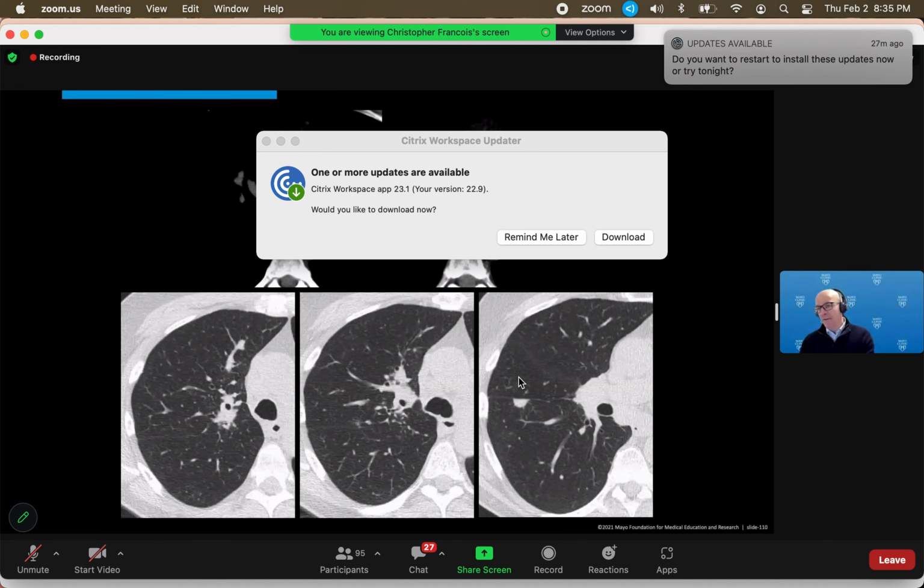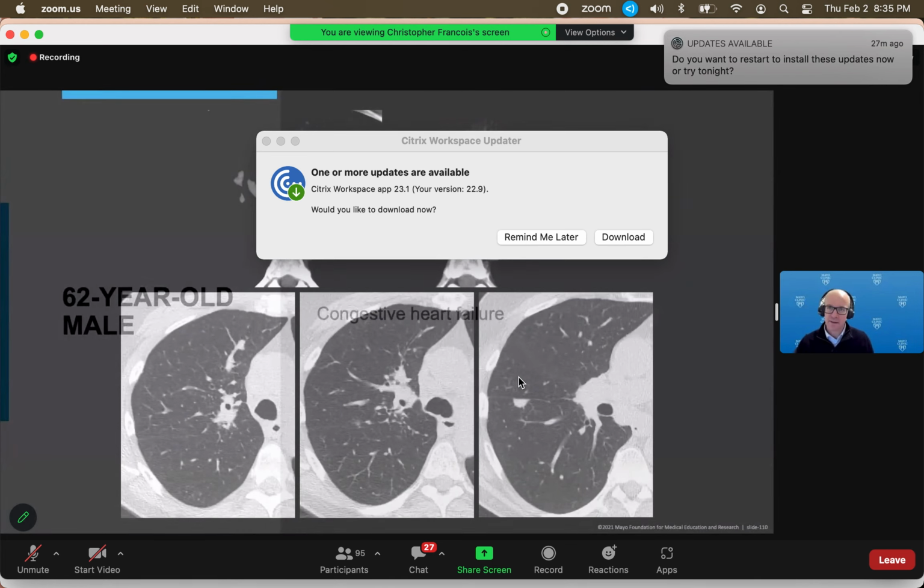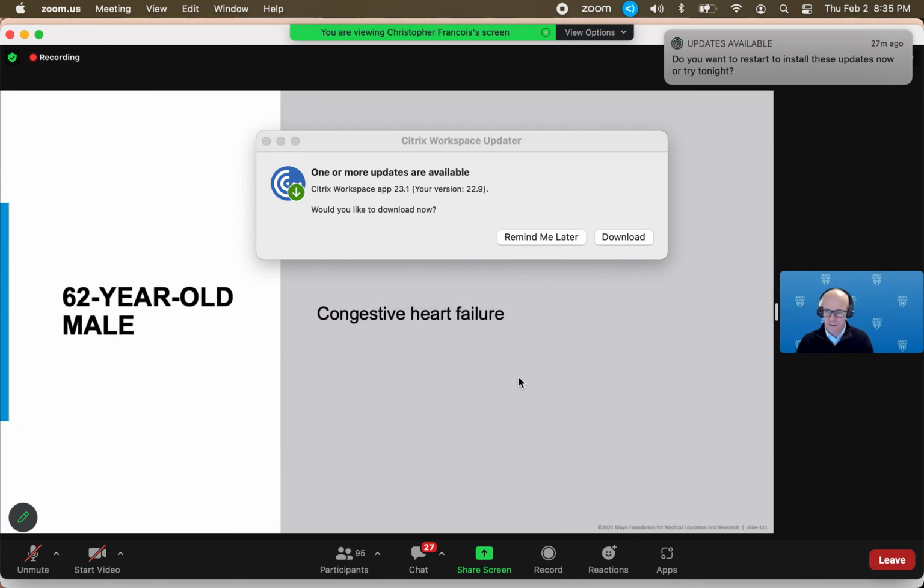So this patient did not have subepicardial enhancement. It was more mid-myocardial, but it was a little bit more focal. And the enhancement that we see on the LGE images is related to the cardiac granulomas. And so I think this will be the last case that I'm going to show.